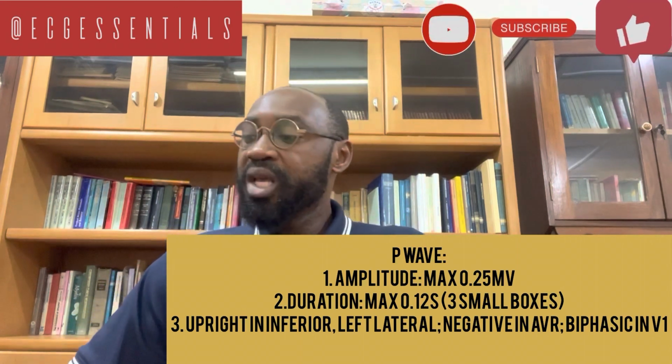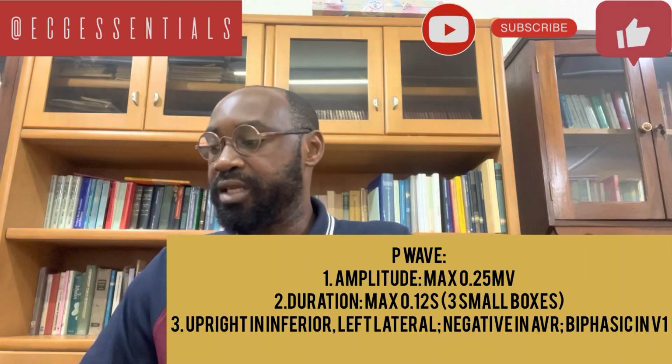And for AVR, which lies far off around -150, we expect that the P waves will be inverted in that particular lead. Generally, the first half of the P wave is considered to represent right atrial depolarization, whereas the second portion, if we divide the P wave into two, represents left atrial depolarization.